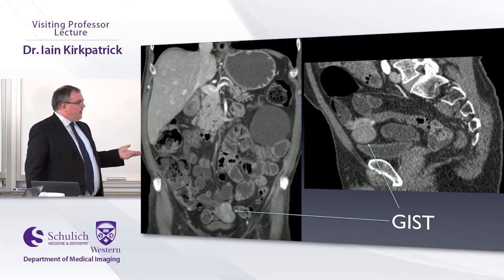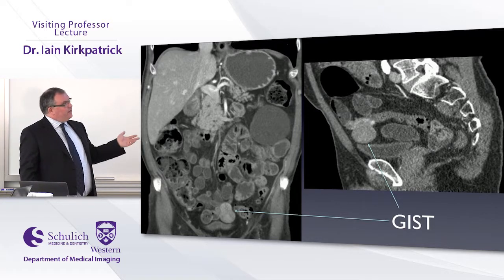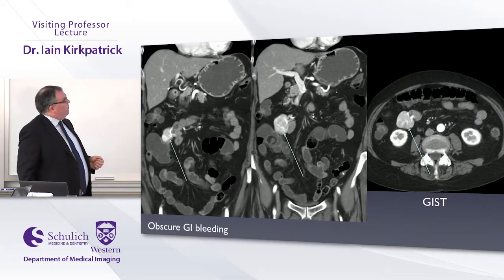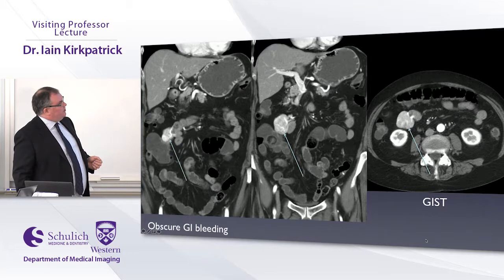They're frequently fairly vascular, fortunately, and they light up quite nicely on the enterographies, and they often have an exophytic component. This one here was actually incredibly vascular, and you can see the feeding artery and vein here, so it's no surprise that it had trouble with bleeding because those are quite juicy vessels.